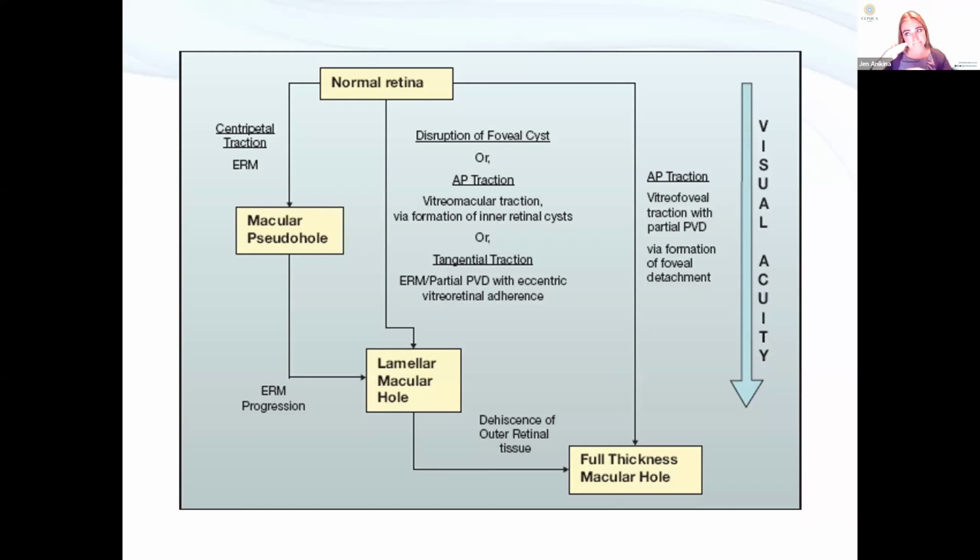What causes ERM? Vitreomacular interaction. It goes back to that vitreoretinal interface. It's some sort of interaction at the point of PVD initiation that causes the laying down of these fibrovascular cells. The things that predispose you to ERM, such as retinal tears and inflammation, are all things that release these inflammatory, fibrotic elements into the vitreous. Funnily enough, a superior retinal tear is more likely to produce an ERM than an inferior one, because gravity will pull all of those inflammatory factors down from the tear onto the macula.